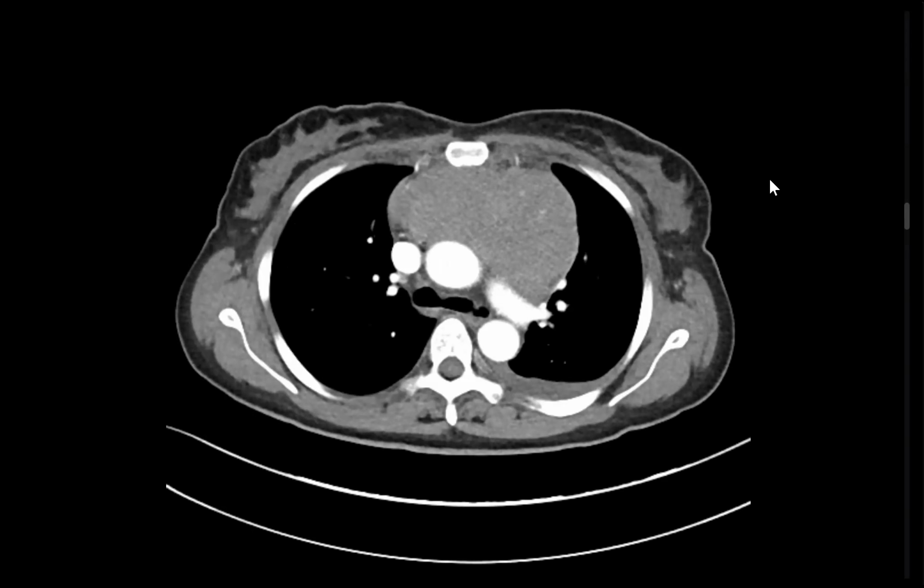Teratoma. But the patient is old. Any other differential? It will be an unlikely differential in an old patient. Treated lymphoma. So I want to compare with previous studies and know if there is a previous lymphoma. Good. Any other differential, or anything from the history you want to ask about?